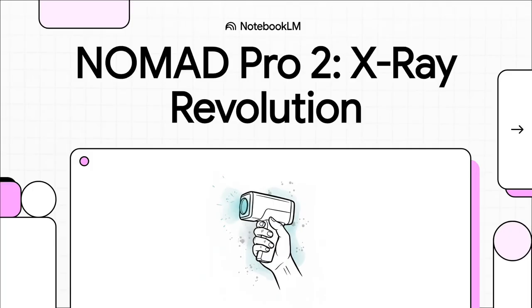All right, today we're diving into a piece of tech that is completely changing the game for dental X-rays. We're talking about taking this whole process out of the dark room and putting it, quite literally, into the palm of your hand. This is the Nomad Pro 2, and trust me, it's a big deal.